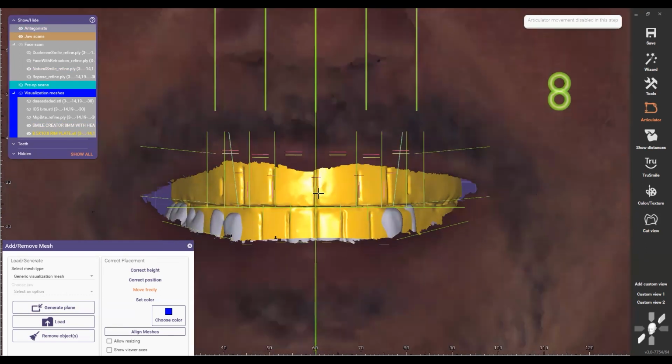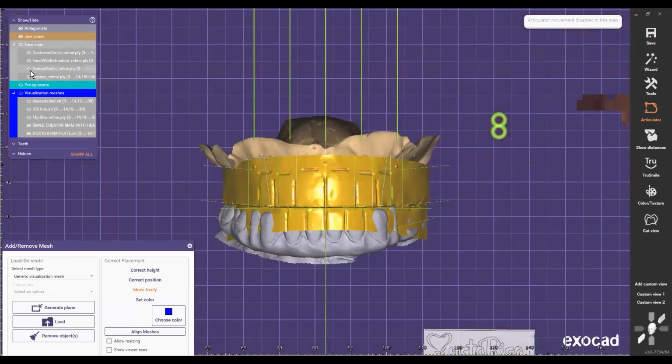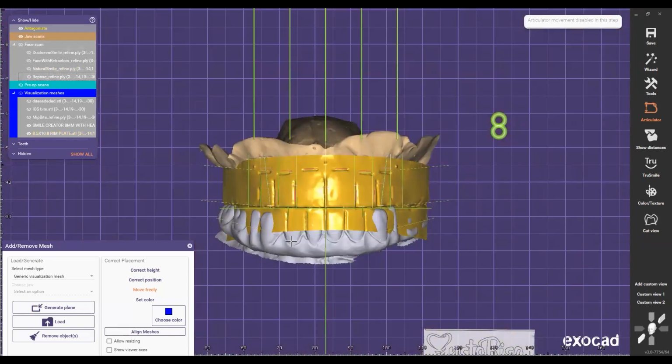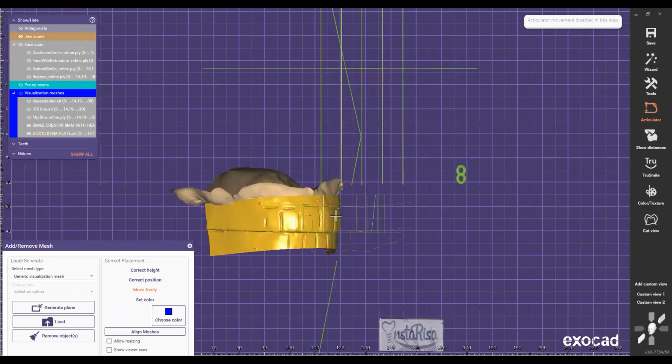So then I said, okay, this looks beautiful now, and I'm going to go to the next one, which is the Duchenne smile. See how it's going to look, looks beautiful. Let's go to repose. Repose is not going to give me much information. So, let's say you like that position based on this one.